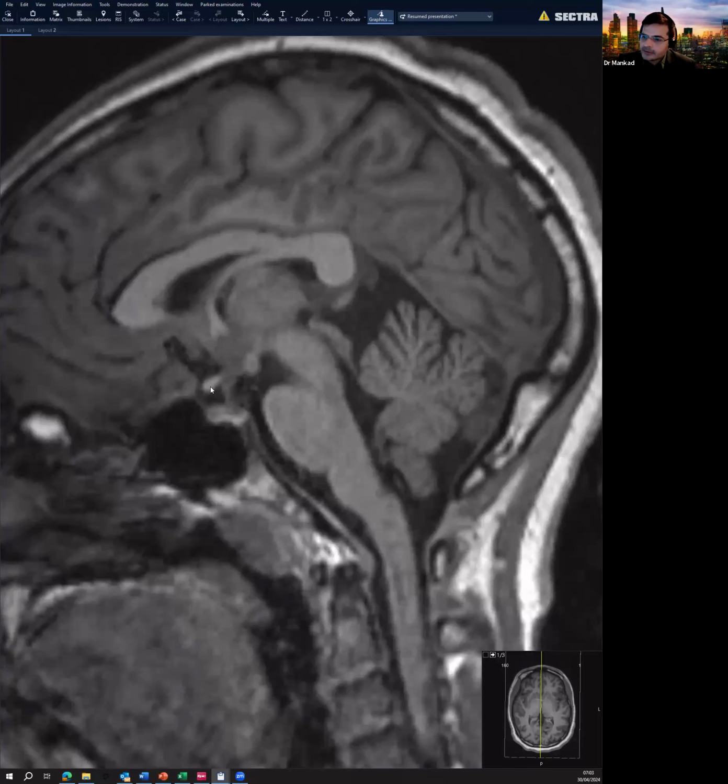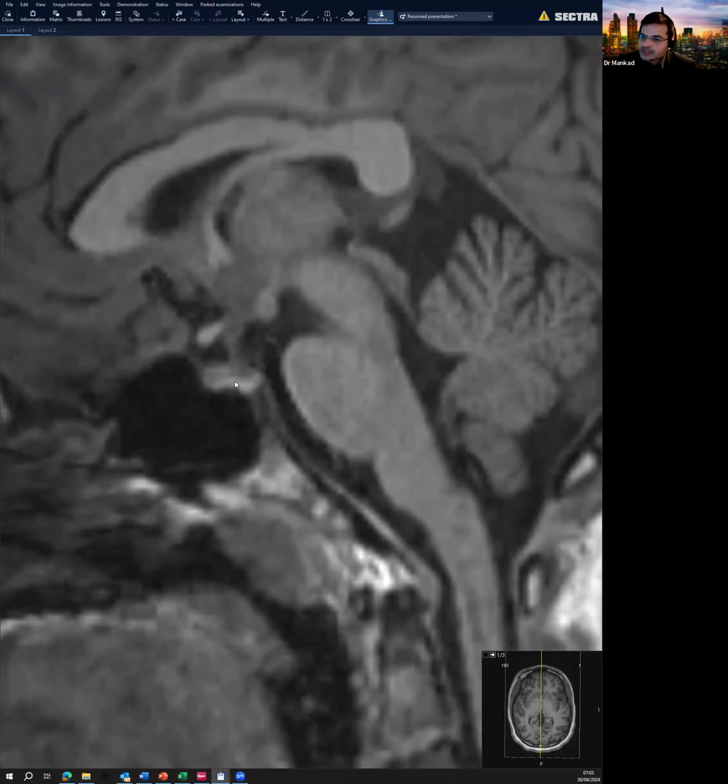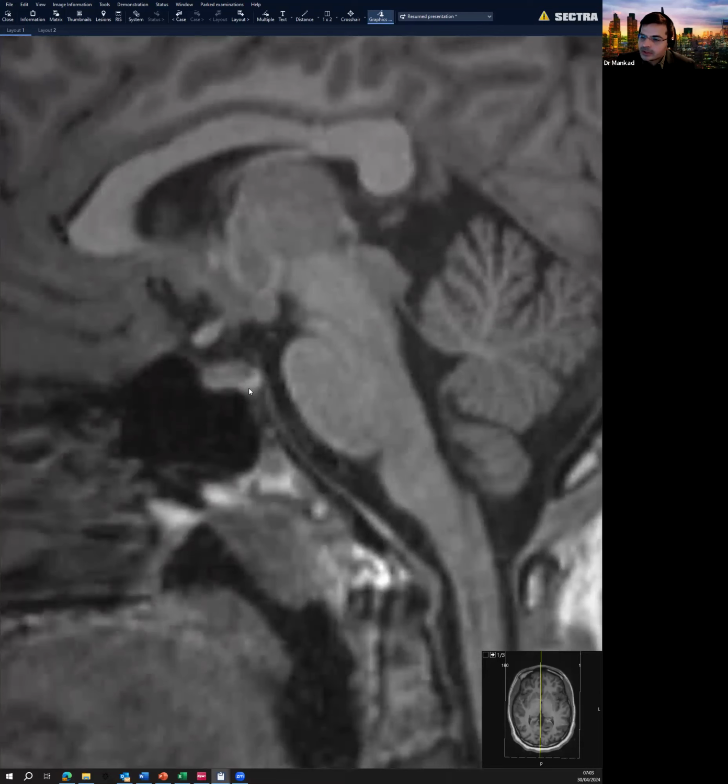Coming up is the chiasm of the optic nerves kind of fusing together out there. So this is a very important arrangement. Optic nerve forming the optic chiasm, the hypothalamic structures, the mammillary body, the stalk of the pituitary, and the pituitary gland itself with its anterior and posterior.